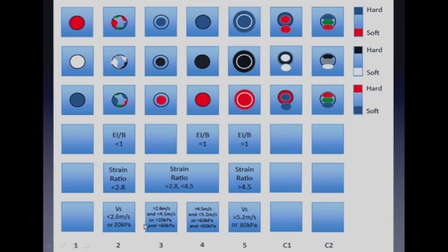And then if we go between the 20 and 60, most of those are benign, but there may be some malignancies based on papers in the literature, so I gave that a 3. And again, I think that now we're able to take all of the methods and come up with a unified method of evaluating breast cancers and showing that these are all somewhat related, as we're all measuring the same factor, that is the stiffness of the cancer.